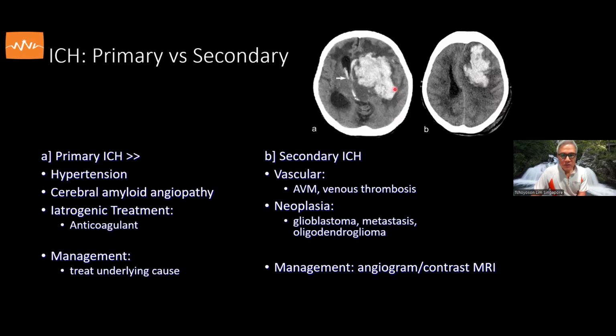So just looking at these two images, in terms of intracranial hemorrhage in a patient with hemorrhagic stroke, we try to distinguish between primary intracranial hemorrhage and secondary intracranial hemorrhage.